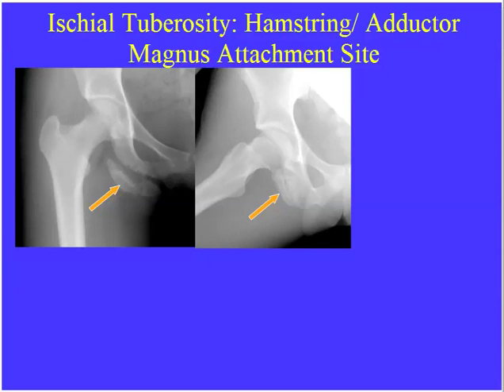These patients can have persistent pain. But oftentimes, this piece of bone remains adjacent to the ischial tuberosity rather than healing back. And so we'll see this thing for many years in this patient. And these are often confused with some type of malignancy or tumor.